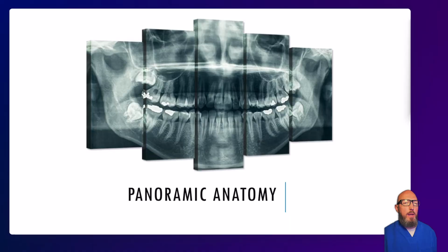Okay, so on to panoramic anatomy. Going through the key structures pretty fast. Same approach as intraoral. Identify it, name it, move on. So if you can't identify it during this video, do your homework.